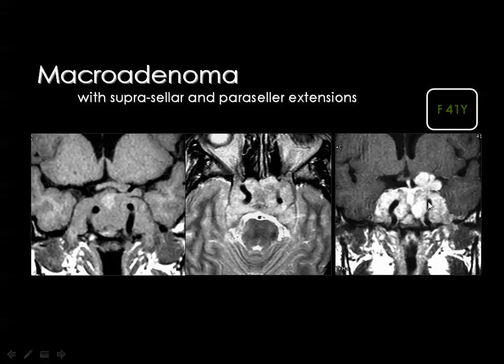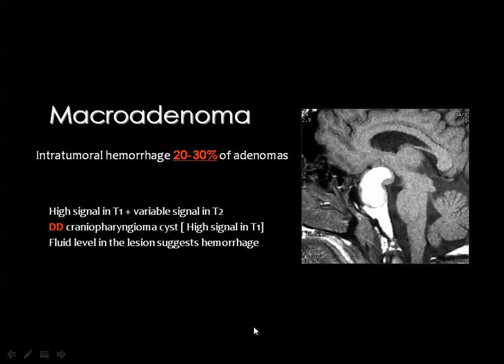You see, this is the carotid artery. You see a good part of the tumor lateral to the internal carotid artery on both sides, meaning that the cavernous sinuses have been invaded by the pituitary adenoma. And one of the important issues here is that adenomas usually do not affect the internal carotid artery. The artery caliber is maintained without encasement, narrowing, or occlusion.